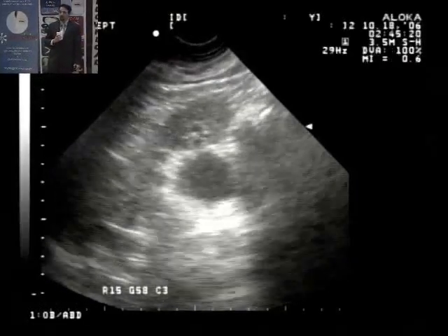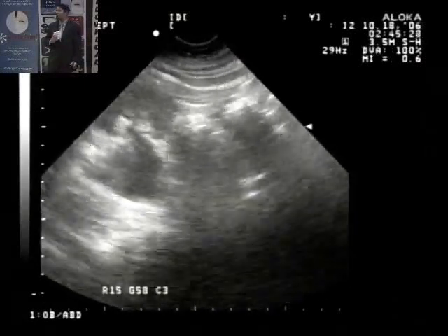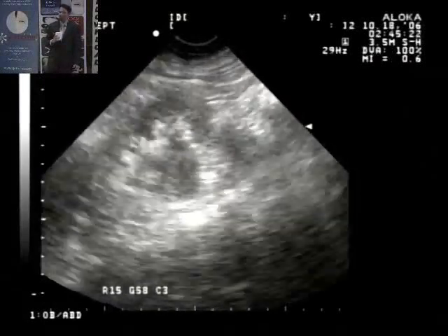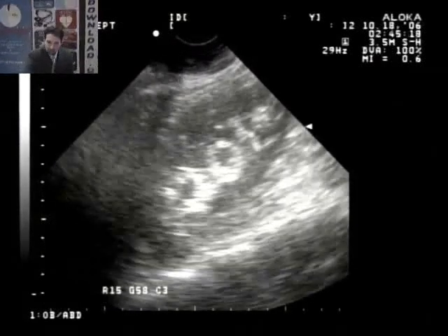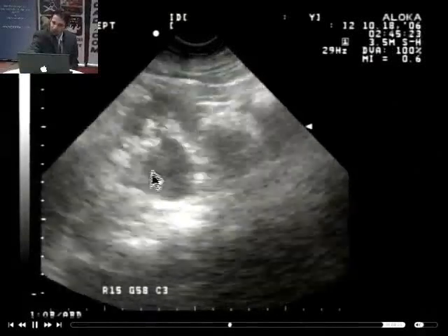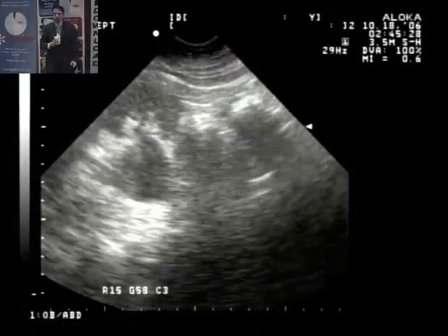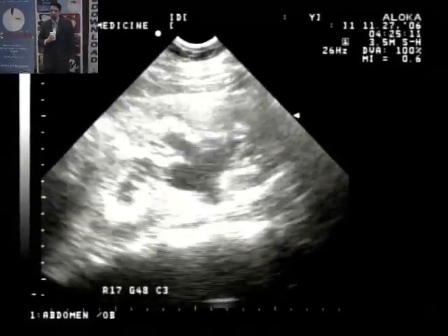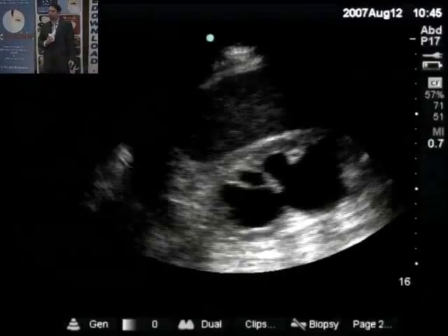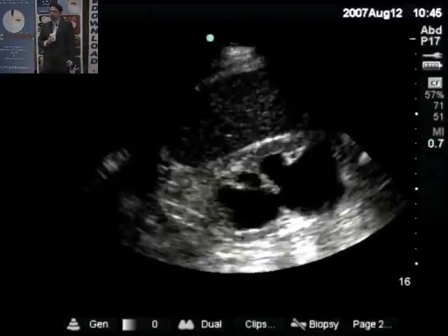This shows how these little small collections of hydronephrosis all gather at quite a significant hydroureter. The ureter is more distended here in this case than the actual kidney is. The kidney here just has these three little pockets of hydro, and as you scroll through, there's this great big collection right at the kidney pelvis. Again, another look at hydro. Severe hydro where the cortex of this kidney is so thinned out, this patient probably doesn't have much function to this kidney.